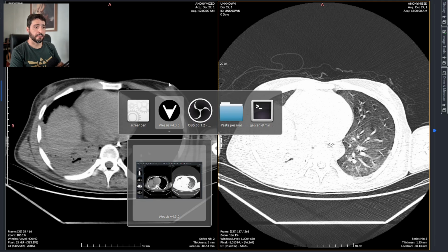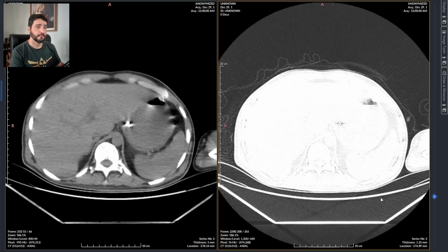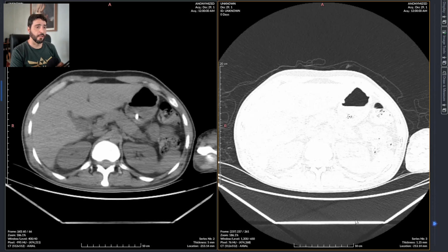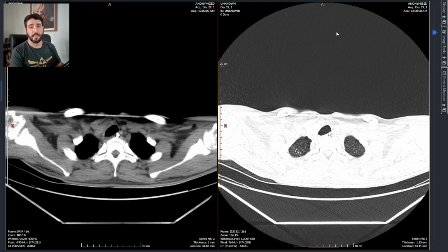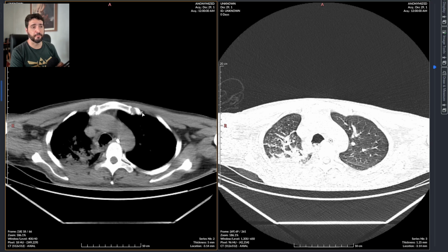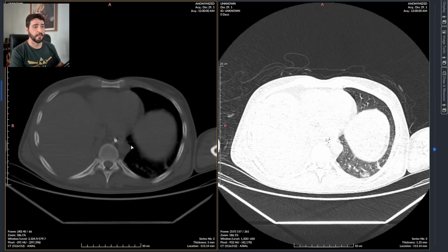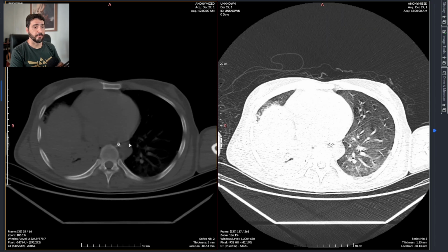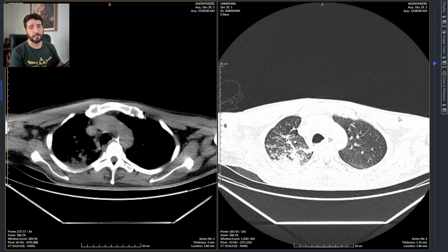So a chest CT scan goes from the base of the neck to the upper portion of the superior abdomen. We usually read a chest scan using 3 window configurations: a soft tissue window, a lung parenchyma window, and a different window to see if we can notice bone lesions. So we have bone, soft tissue, and lung parenchyma windows.